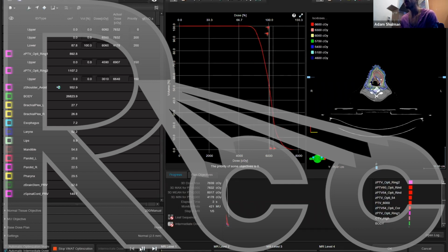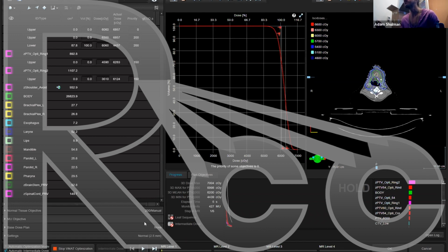So early on in any optimization is where you can do larger motions of your MLCs. This is where you'll block major sections of your arc angles or of your static gantry positions where you're blocking, say, a parotid or the spinal cord. And then later on, we just want to fine tune those MLCs to get coverage of PTV.